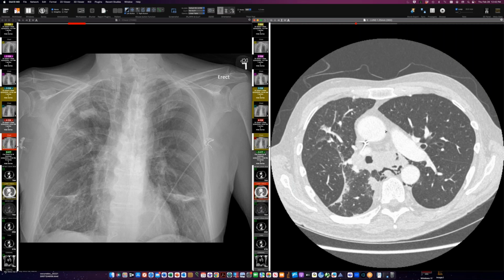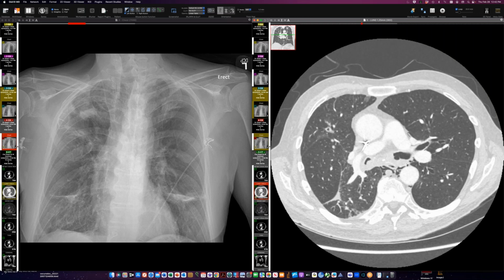So you might be able to squeak a little bit of air past it, but you're going to make this more obstructing on ventilation. And the air that gets trapped in this left lung then contributes to the worsening of the mediastinal shift, and that's why the mediastinum shifted to the right. And the left lung became a little bit clearer on intubation because we were trapping air in it. So air was being trapped in it.